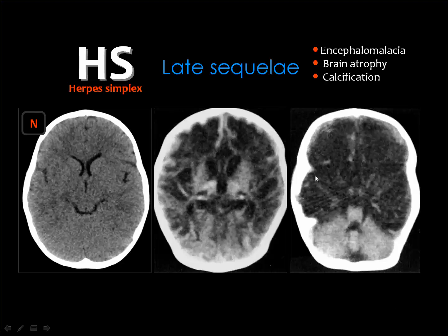And this is frequently seen in the pediatric hospitals, where the patient had herpes encephalitis or any type of encephalitis, and the follow-up will show the end result of this attack of infection, damage of the brain tissue, many areas of liquefaction or encephalomalacia. Sometimes you may get calcification, but you do not see contrast enhancement if you inject the contrast material.